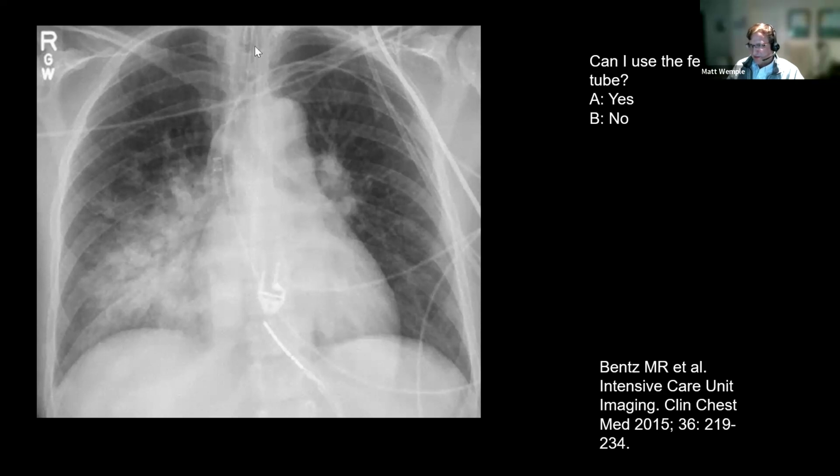So here's the tube going down. It kind of curls around, but then it curls back up. And actually, it's curling back up in a direction I don't like because it's probably curling back up into the esophagus, and as you start feeding that, it's potentially going to regurgitate up the esophagus. And I think this patient actually aspirated this tube feeds is what's going on here. So it went all the way back up and then down into this right main stem.